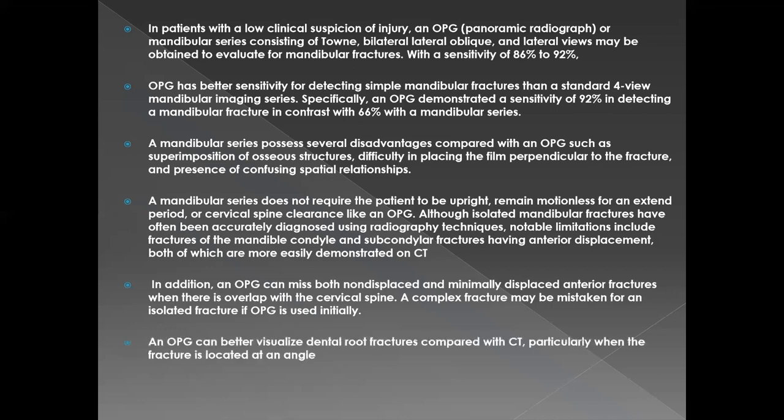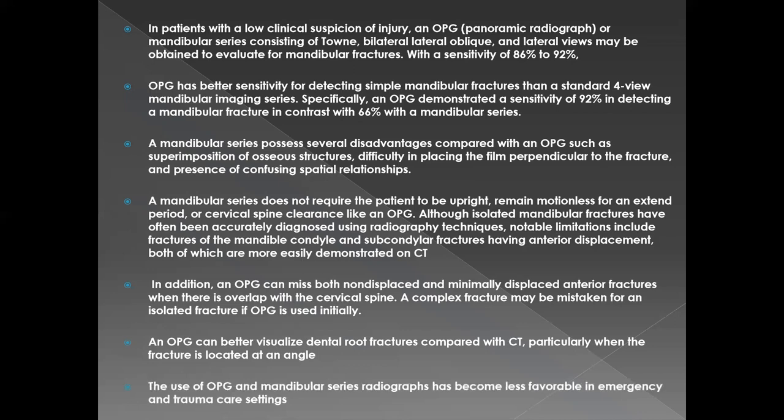Anyhow, a complex fracture, like I said, may be mistaken for an isolated fracture if OPG is used alone. An OPG can better visualize dental root fractures compared with CT, particularly when the fracture is located at an angle. The use of an OPG in mandibular series X-rays has now become less favorable in emergency and trauma care settings for obvious reasons.